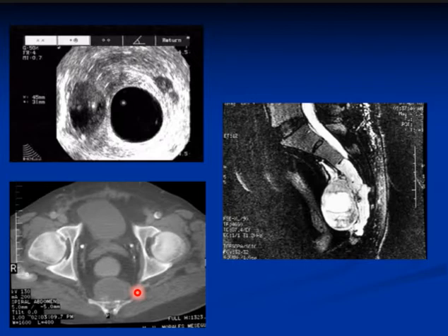But what is suspicious here? Well, bone erosion. Yeah, there is bone erosion right here. You can see this area here and the osteoporotic nature of the adjacent sacrum. There is preservation of the fat planes between it and the rectum. Good. Now, let's go to the MRI.